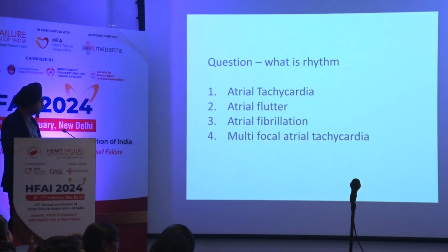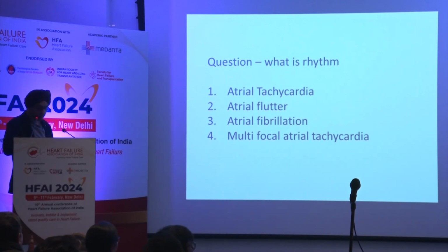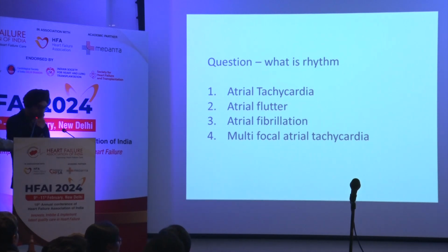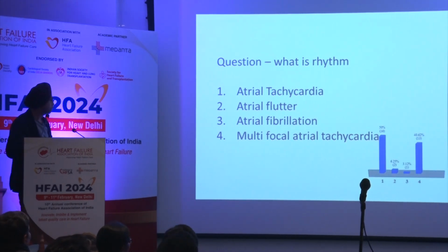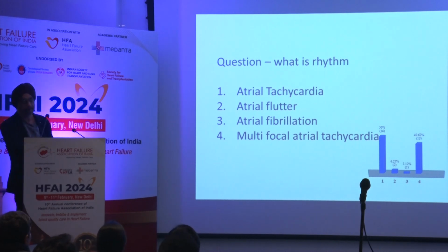So we go to the question. So what is the rhythm? Atrial tachycardia, atrial flutter, atrial fibrillation, or a multifocal atrial tachycardia. So we can start the response. So half of them think it's atrial tachycardia. So why is it important to diagnose this arrhythmia?